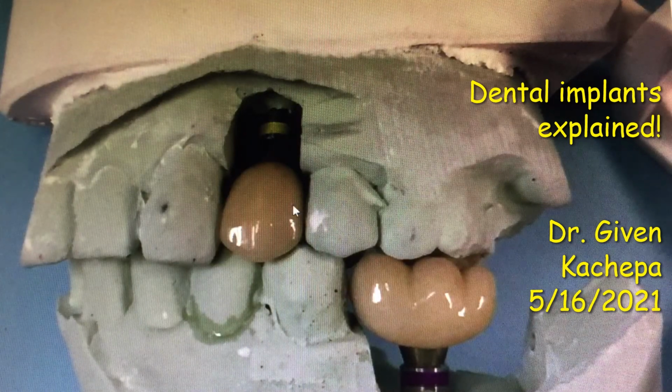Here was another case that was actually done by a different dentist. They placed the implants here, and then this patient ended up coming to me to do the restoration here, these implant retained crowns. It turned out to be a really, really good case.